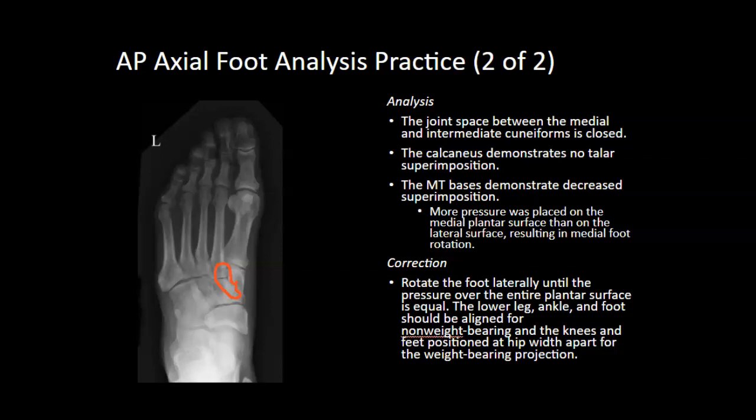Also, the calcaneus is demonstrated with no talar superimposition. This should indicate to you that the foot was medially rotated. In order to correct this, we need to rotate the foot back to its lateral side so that the foot is flat against the IR.